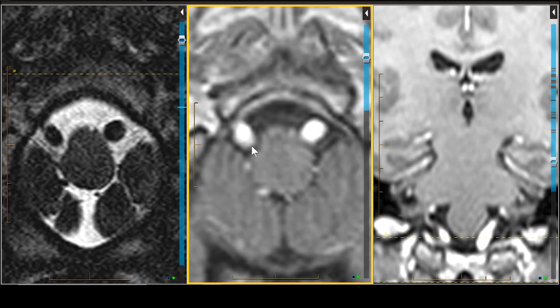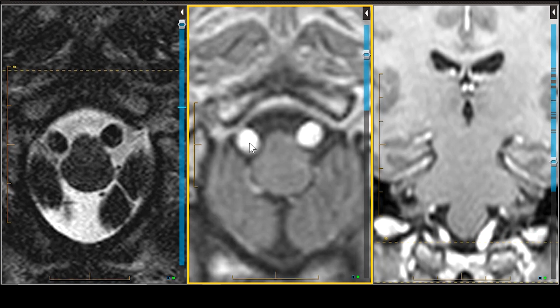Then as we scroll down, we lose the nerve for a little bit, kind of gets buried and hidden by the pulsation phenomena and anatomy of the vertebral artery, but there is our hypoglossal canal with an anterolateral course. We said there are multiple rootlets that converge into one nerve, sometimes two nerves traveling together, but no more than two trunks is what you see with the hypoglossal nerve. Now, the hypoglossal nerve passes through the subarachnoid space. It passes the dura mater in the hypoglossal canal and in the opening of the occipital bone as we described.